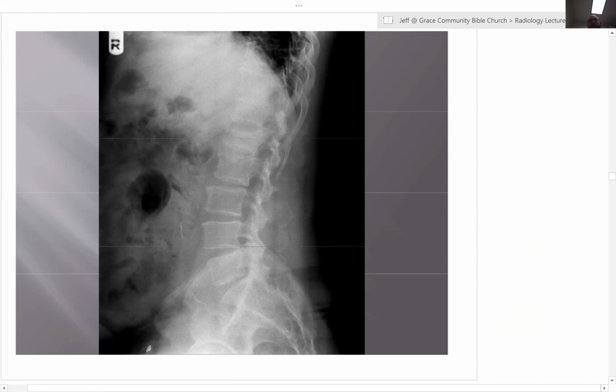And so do you like this one for aggressive or non-aggressive with a history of a sledding accident and this finding? Aggressive or non-aggressive, or regular compression fracture? Yeah, non. And next question, do you like acute or chronic with that sclerosis and with the step sign up front? Chronic.